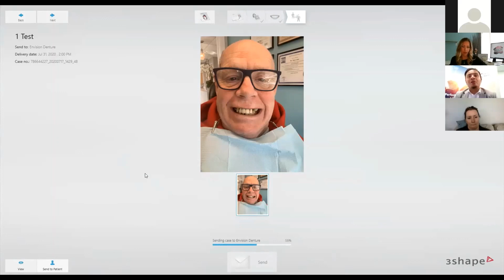Okay. And I know what you're looking for, it shows the before and after pictures. I think if you hit send, that's when they're going to appear. Yeah. So the patient will receive some staggered photos of what we've done. It'll ask them to create their username and password, and it's basically creating their account. They'll be able to toggle through and see what we've created for them. Yes. So there you go. I don't know if I missed anything here.